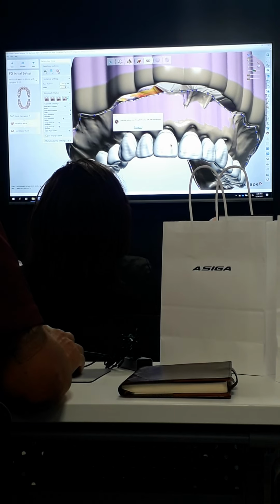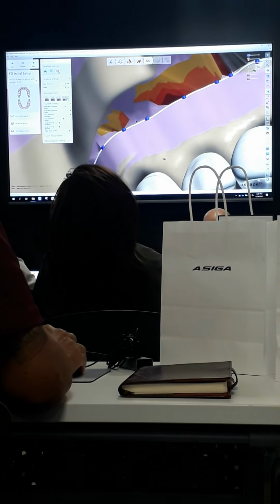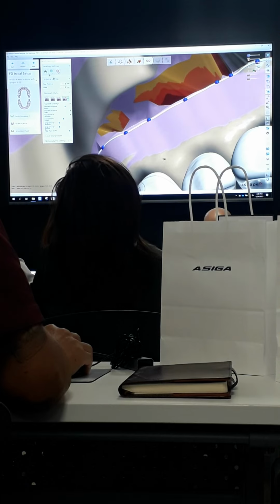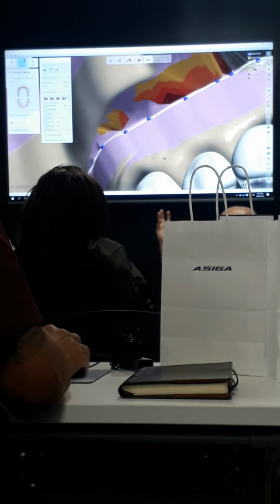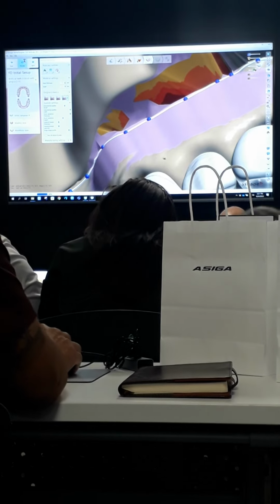Anytime you get the self-intersection, see how it gave me this here? And it said that it was through a self-intersection. That's when you get too close to those large triangles. So I need to lift this area up. And it's always a good idea when you're doing these, unlike what I did, to zoom out so I can see the whole arch, so that if that error comes up, as soon as I hit OK, I can see where it's flashing and go fix that spot.